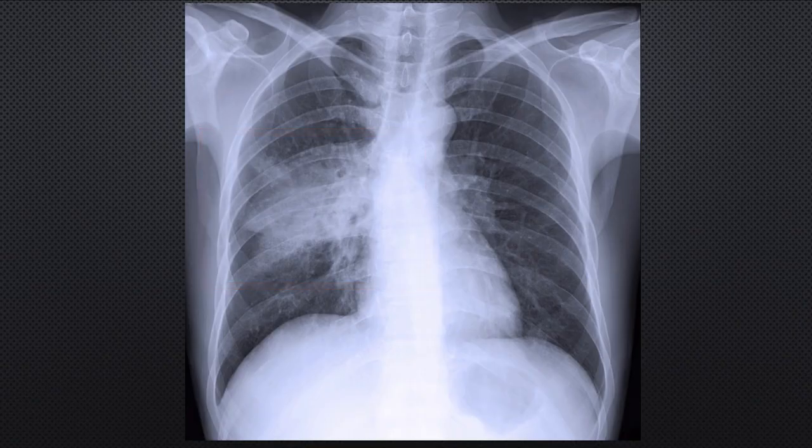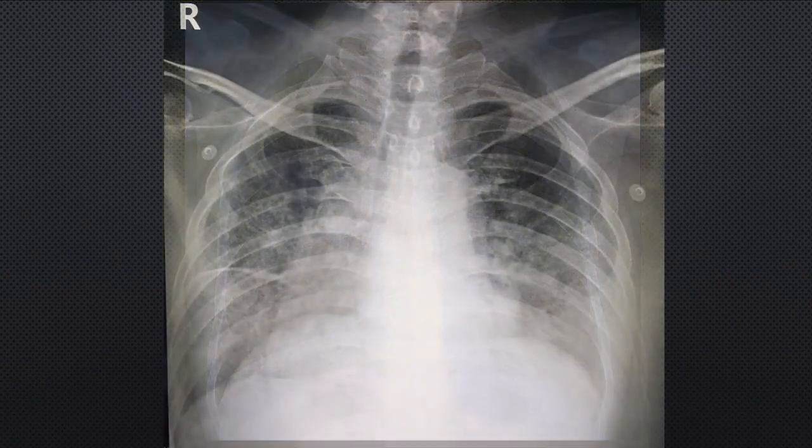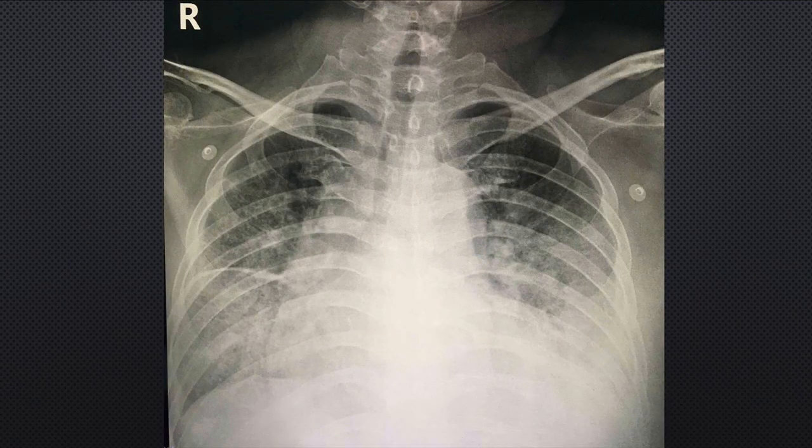Pneumonia is an infection in the lung and can be caused by bacteria, viruses, or fungi, but it is important to note that the chest X-ray appearance alone is not definitive for pneumonia. Any process causing the abnormal accumulation of fluid or cells in the otherwise normally aerated portions of the lungs will create the appearance of increased density. This is our last image for this lesson.